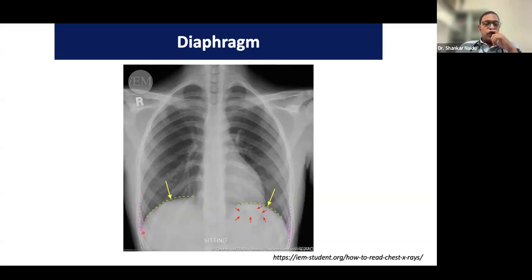These have to be very acute in angle and they should be tapering down like this in a normal individual. So if there is any abnormality, sometimes when there is a mild pleural effusion, these might be the earliest changes that appear, where the costophrenic angle is obliterated. So we should always give importance to checking the costophrenic angles for early detection of effusions.